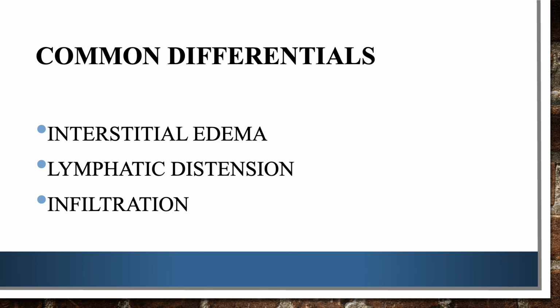Lymphatic distension as in lymphangitis carcinomatosis is also very common and important differentiation in case your patient has a malignancy. There could be venous stasis in pulmonary vascular occlusive disease. It could be asymmetric, and sometimes you have associated findings like cardiomegaly, like presence of hilar lymph nodes in sarcoidosis, or a mediastinal mass lesion along with lymphangitis carcinomatosis that can help you distinguish.